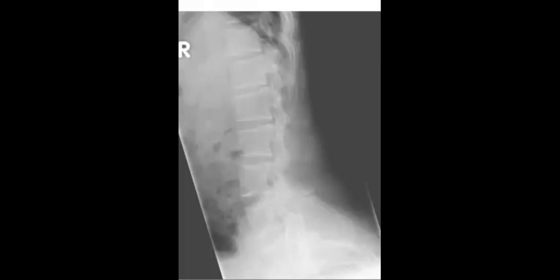Thank you, Marwa. I see your answer in the last case about myelofibrosis. You need STIR to differentiate edema from sclerosis, unless a STIR is given. Because the STIR is very sensitive for edema, for the fluid signal in general, so it will be very high in the STIR. Okay.